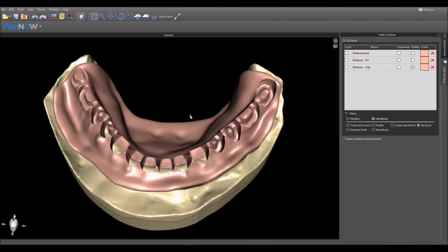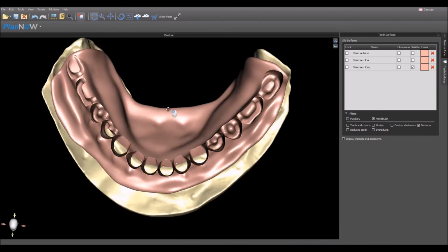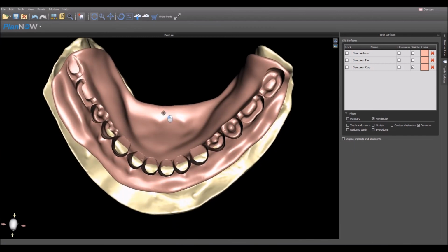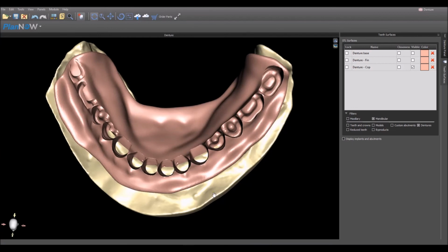And we also have the reduction, the coping reduction surface that was created. If we're going to be manually reducing physical teeth, then we could insert them into this base. And if we turn over the base with the teeth, then the part that's protruding through the base is the part of the physical tooth that should then be reduced. So we have our reduction coping.